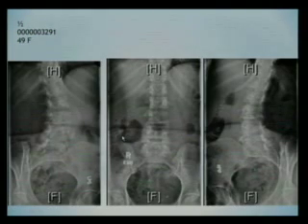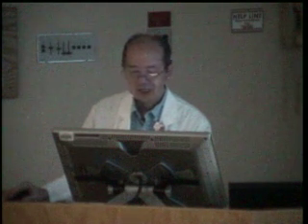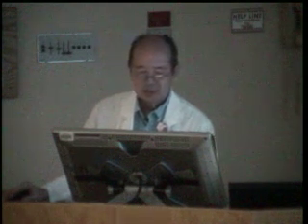Okay, who sees the abnormality here? It's in the spine, okay? Forget about the rest of the skeleton. Which one? Exactly. This is called the winking pedicle sign, and it can be deadly if you miss it. Because usually it is a metastasis.